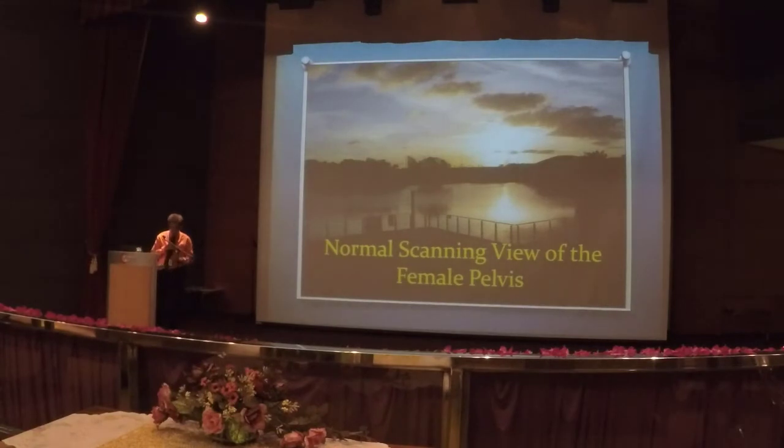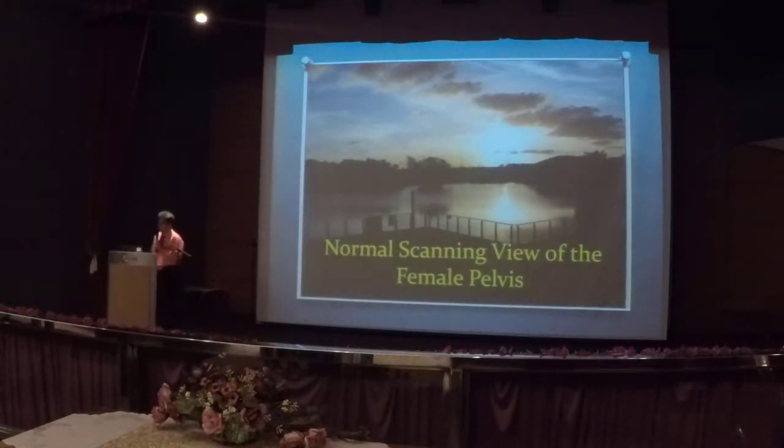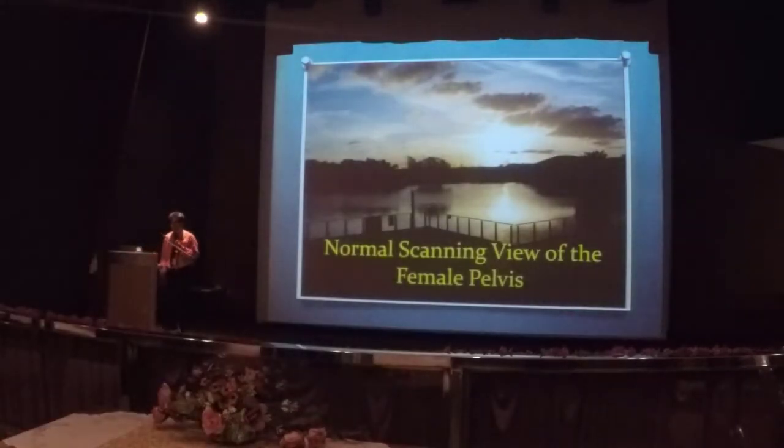So the first, pertamanya, before kita dah mula, kita kena ingat bahawa when we do ultrasound scan of the pelvis, sama macam we are looking during the dusk period, where everything nampak black and white, sometimes yang ada colour pun Doppler saja, bukan? So far tak ada lagi ultrasound yang boleh kita bubuh dia kat situ, dia terus keluar macam 3D picture and also give you diagnosis. So you still need to have the human to interpret the image.